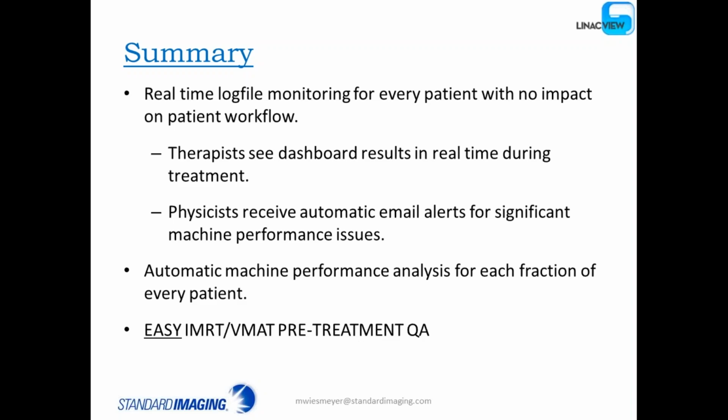So what we've got is real-time log file monitoring for every patient with no impact on patient workflow. Really, the only thing that is time-consuming, or well, not really time-consuming, is that when you send your RT plan from your treatment planning system to your R&V system, you also send it to the LinacView folder.